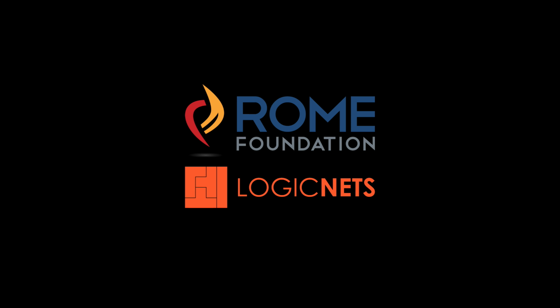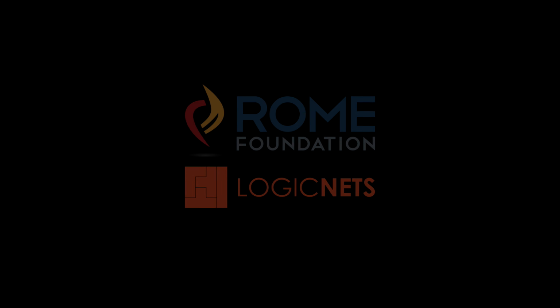Welcome to a demonstration of the Rome 4 Interactive Clinical Decision Toolkit. This new intelligent software system is designed to help practitioners achieve optimal clinical outcomes by helping them navigate in a sophisticated manner through the Rome 4 functional GI disorder diagnostic and treatment protocols. Using any browser-enabled device, physicians and clinicians can interact visually with the Rome algorithms.